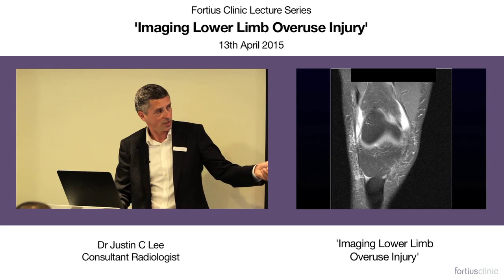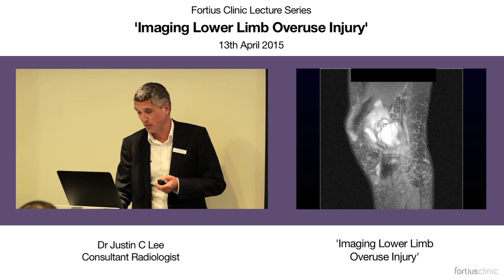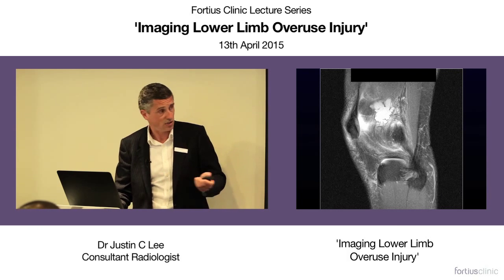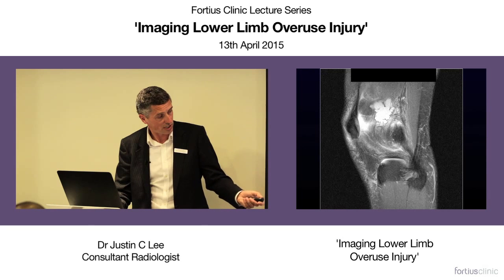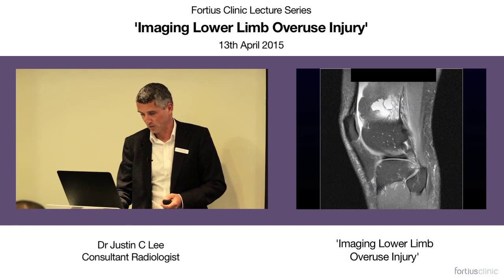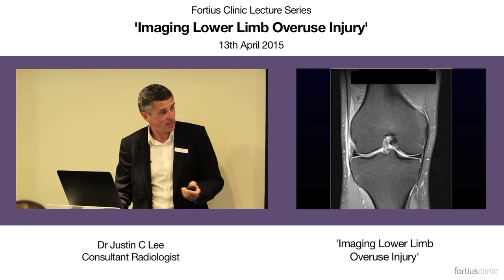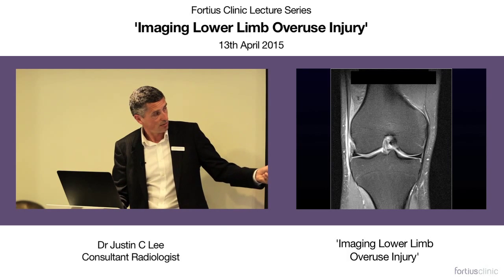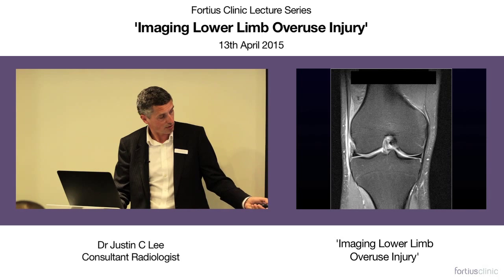But you've got to be careful because he has an effusion, and before you know it, you're calling an ITB bursa in somebody that actually just has an effusion. But this is slightly different, and you can see again limited posteriorly by the lateral collateral ligament, biceps femoris tendon coming down. This is much more common, and again, even this is quite a severe case because most of the time, now this is the iliotibial band, this black line coming down onto Gerdy's tubercle.